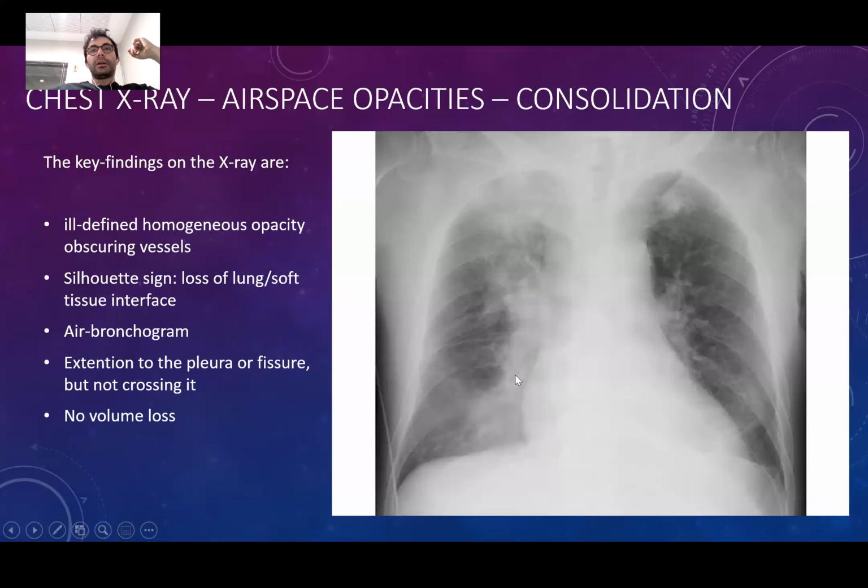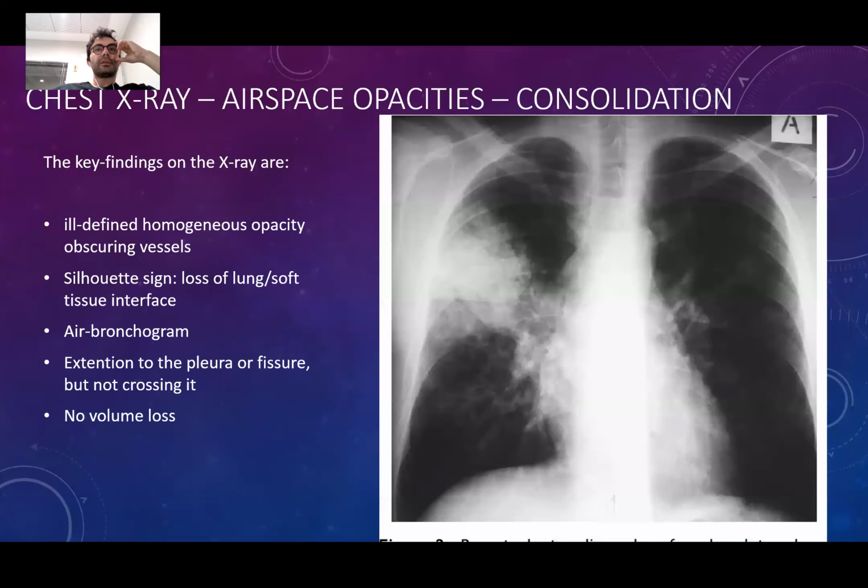In this area, I have seen the bronchus as a dark structure, which is totally not seen here. Can you see it? This time there is no pleural fissural extension and no silhouette sign, so these are not a must. But we should educate our eyes to the hazy appearance.